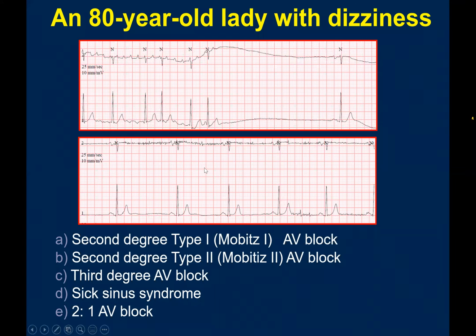And then when this stops, normal people, when they have fibrillation or flutter, you see post-operatively for example, they go back to sinus within 1.5 seconds. If it takes a long time to come back to sinus rhythm, this indicates the sinus node is not functioning normally. And typically they also have bradycardia. So that's what we call tachybrady syndrome, and in between they have long pauses. This is the common form of sick sinus syndrome in elderly, tachybrady syndrome.